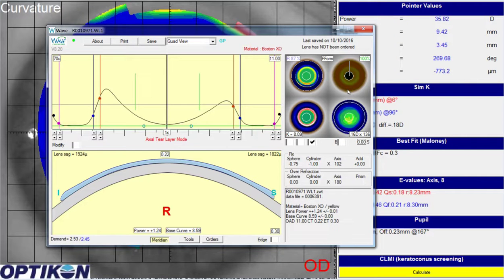The more common situation we run into with wave orthokeratology, especially myopes, is not correcting enough of with the rule astigmatism. But in this case, this is the opposite. We actually want to have more of it on the patient's cornea. And so to do that, what we're going to do is loosen the vertical meridian. And this will be in 50% mode. And I would try to go about 17 microns.